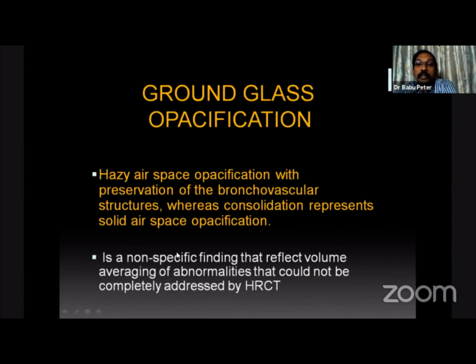So we have just covered the two patterns, the nodular pattern and the reticular pattern. We shall now proceed to the next pattern, which is ground glass opacification. So what is ground glass opacification? It is actually a non-specific finding that reflects abnormalities which are not otherwise evident. The term ground glass is not used in chest X-ray; it is basically used in HRCT.